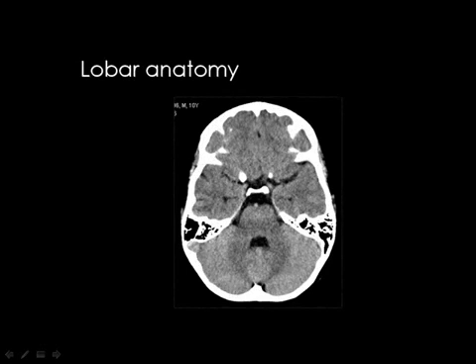Then, if you see a lesion in the brain, and you would like to say the exact site of the lesion. If the lesion is here, what do you say? Left cerebellar hemisphere.